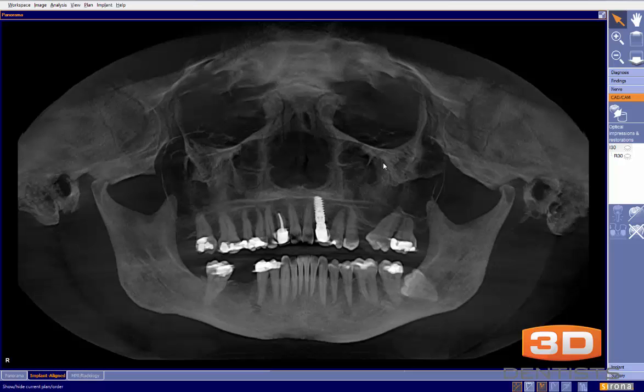Okay, we've been sent another case here. In this particular case, our patient is missing a lower right first molar, tooth number 30, and we want to plan an implant there. So this case was submitted, and the notes on the submission were, can you please evaluate the implant for implant placement for this patient?